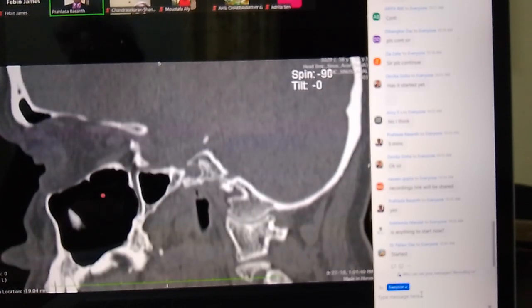Okay, further medially we go, the frontal sinus and roof of the orbit, anterior clinoid process. Okay, and this is the pterygopalatine fossa, which will continue as palatine canals here, passing through the greater palatine, lesser palatine foramina downwards, and this is the pterygoid pneumatization, fossa of Rosenmuller.